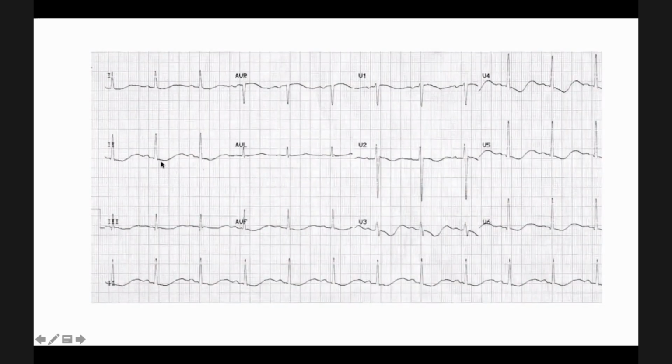So in this ECG, you can see this hypokalemic ECG. There's a significant ST depression and also the presence of U waves. Okay, and these are the U waves. If you see something like this, diffusely in all the leads, don't diagnose ischemia, because ischemia is not present in all the leads. So if you see something like that, you have to suspect that the patient is having hypokalemia.